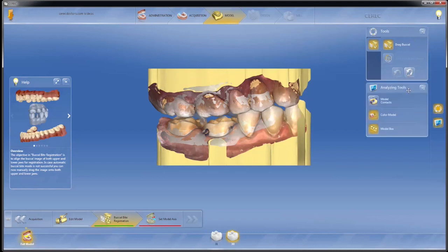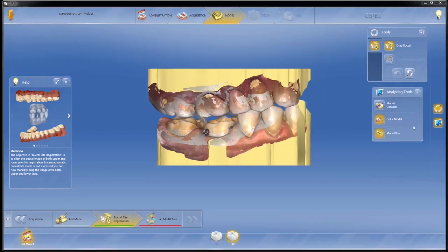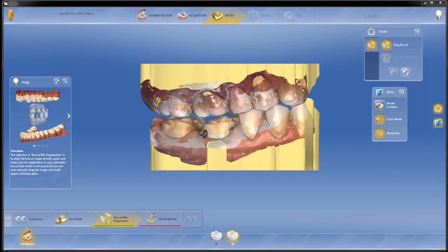In fact, you can have them open and you can set your surgical stage, your design stage, any way that you would like. So you can move these around, you can minimize them, you can make them larger, smaller, so that you can adjust this to the level of space that you need on your desktop. And the nice thing is every time you come back to a screen, however you've laid out that screen, the software will remember. So we're at the model phase.